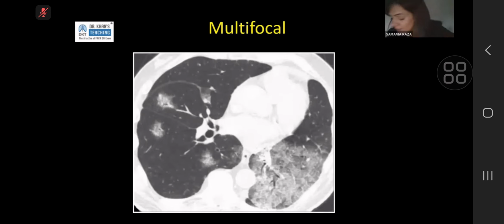This one, a slightly unknown entity for non-thoracic radiologists that can catch you out, is something called multifocal adenocarcinoma. You can get multifocal, widespread cancer within the lung, and this is primary lung cancer. And this is just along how it spreads. So it can sometimes spread around the air spaces, around the interstitium. It goes along the airways, along the interstitium, and actually just spreads like an infection rather than a tumor eating through. So it can look like a ground glass opacification.